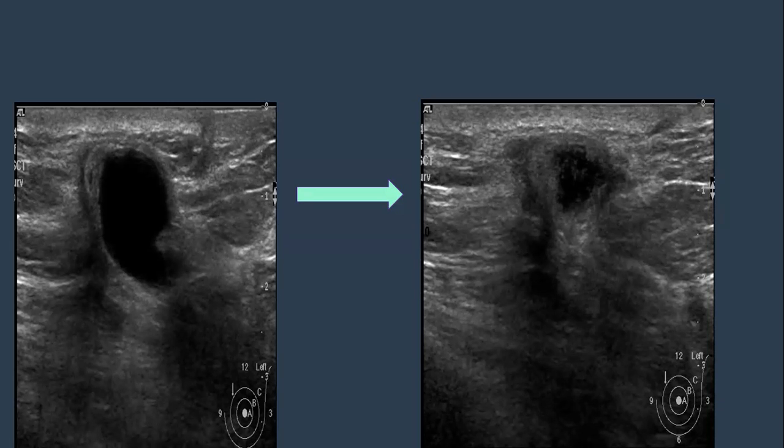Is it fat necrosis? Yes, it is a typical fat necrosis. Okay. So this case was no recurrence. We are just going to follow the case to see the next follow-up, but it was not suspicious from the appearance. It was going with a fat necrosis, and no need to go for MRI.